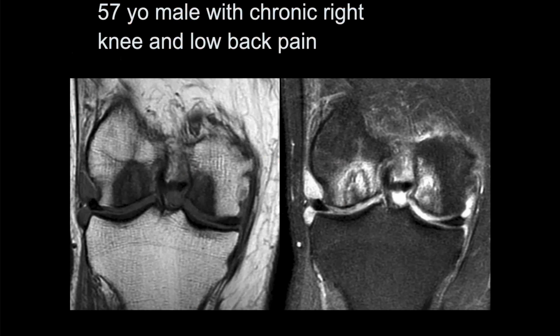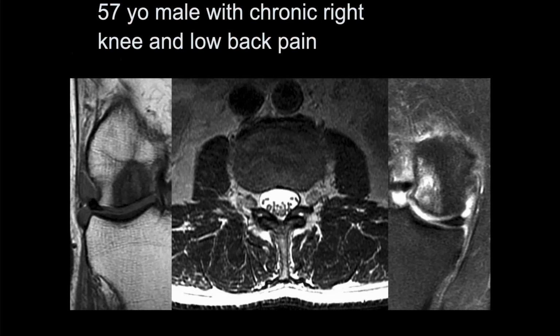57-year-old male, chronic knee pain and low back pain. Subchondral bone in the femoral condyles. It's increased signal. Serpiginous signal could be osteonecrosis. Okay, could be osteonecrosis.